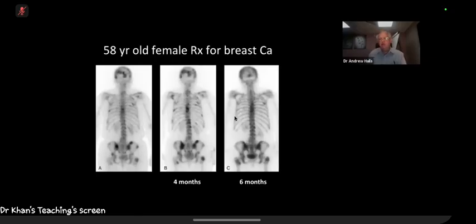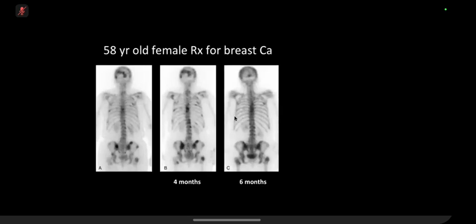Okay, so just to clarify, in between the first image and the second image, was the patient getting worse, having progressive disease, stable disease, or you think they were improving? So if the patient was having treatment at that time, in the early phase of treatment, it's actually quite difficult to characterize if it's the disease which has progressed or if it's just response to immediate treatment. That's my understanding, but I could be wrong there.